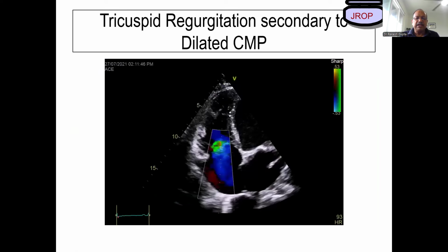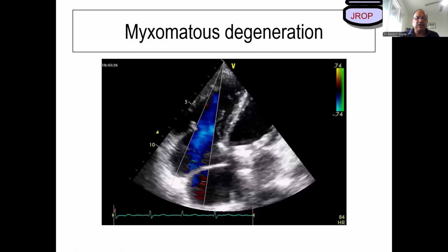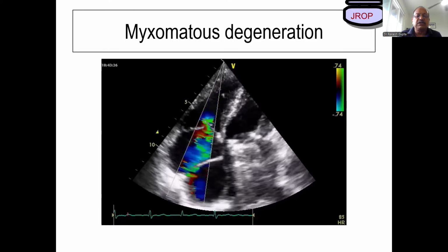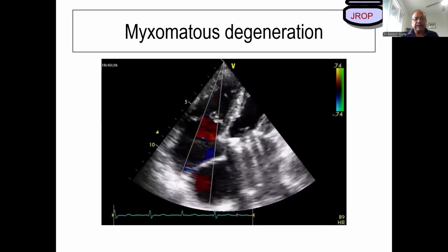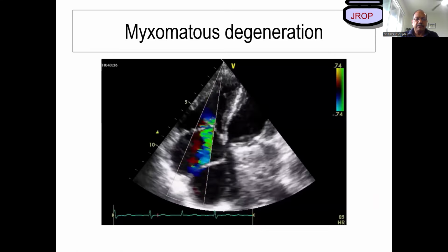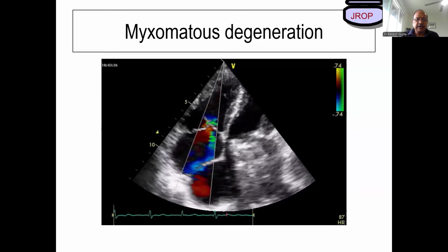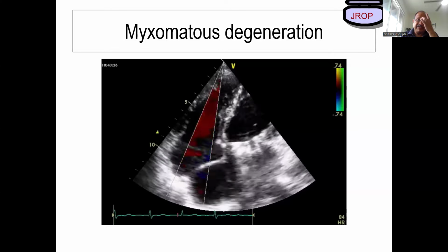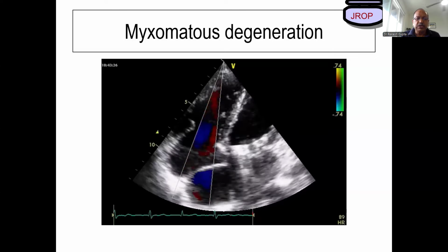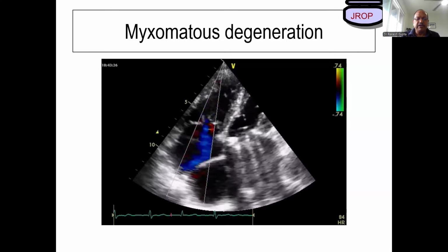Now let me go back and ask you what kind of abnormality this is. Anybody will open their mic and let me know. What is this abnormality? In which class do you classify this myxomatous degeneration? Anybody would like to take a vote? Flail leaflet, sir. Pardon? Flail leaflet. No. Classification of tricuspid regurgitation. Which category? Grade 1, 2, 3, 1A, 1B, 2A, 2B, 3A, 3B.